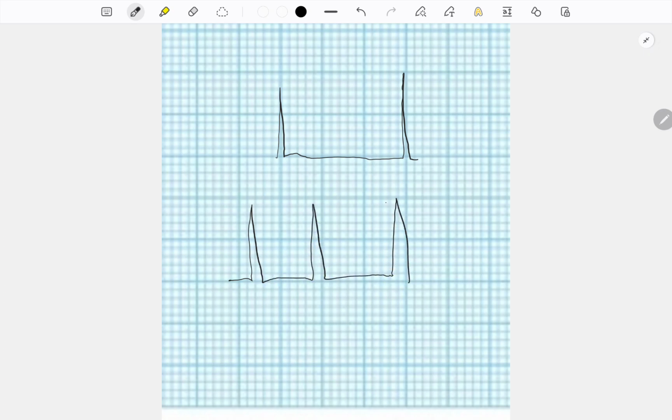Let me draw it at even, something like that. It would be more accurate to attempt to count the tiny boxes, 1, 2, 3, 4, 5, 6, 7, 8, about 8, than to count the big boxes because they're not quite a whole number. And we're going to get into that more.